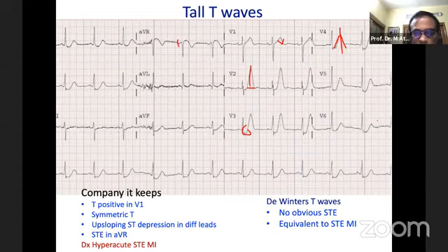This is the rising and declining part, that is the first part and the second part of the T wave, that defines whether it is symmetrical or not. So these are symmetrical T waves. We are confused with V4, V5. These are not symmetrical at first look, but these are symmetrical T waves.